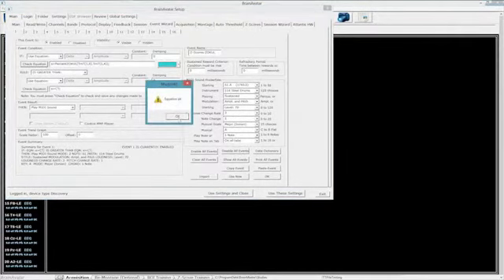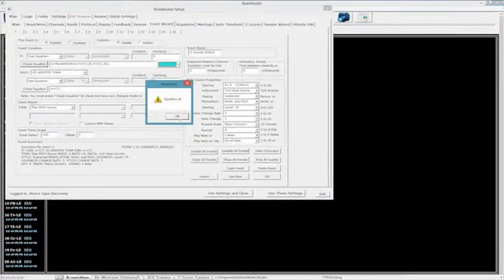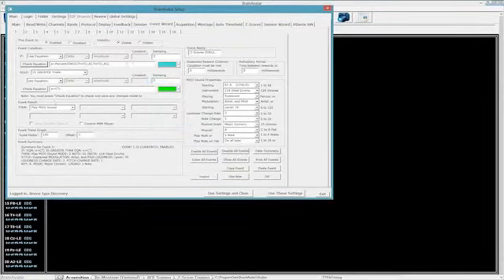Now, you might be asking yourself some questions right here, like why do I keep hitting check equation? For those of you who are used to the old Discovery and 3.0 series software, you could never make a change in the Event Wizard without hitting the check equation button. In the latest BrainAvatar software, in some of the different versions, you can actually hit Use Settings and Close, and all the changes occur. The only thing is, if you make an error, you don't know unless you hit this check equation. When you hit that and you see equation OK, you know that whatever you put in is a valid thing and the software understands it. So that's why I always hit check equation.